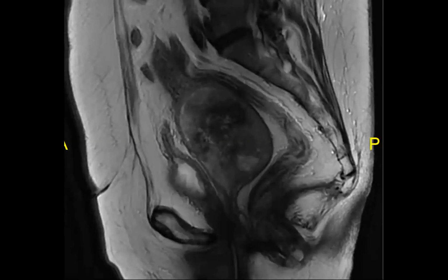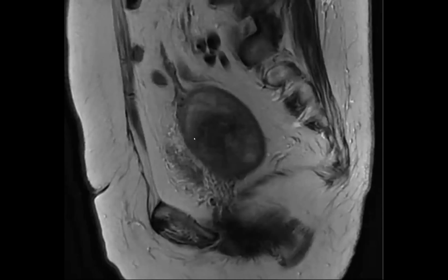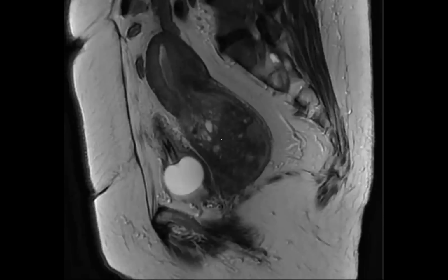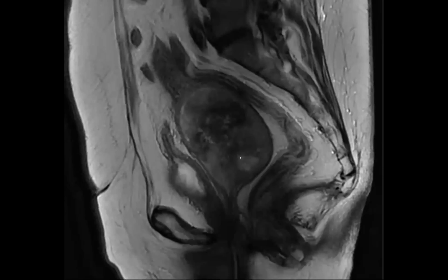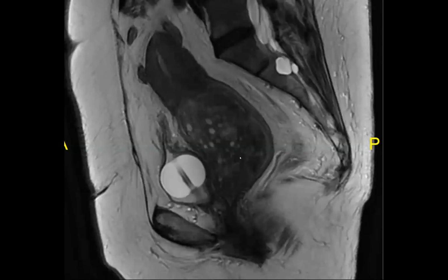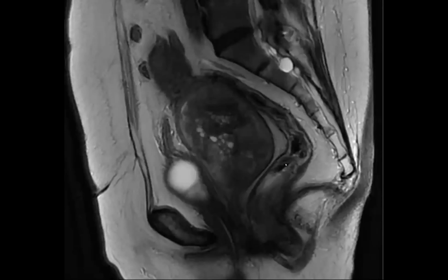So the path came back, and this is an interesting path. The path came back as adenosarcoma, right? So then I'm like, oh crap, I really didn't think this through. But when I read the path detail, it's actually pretty cool. This whole thing is a huge endometrial polyp, and there are a few microscopic areas of sarcomatous changes. So it wasn't completely far off. This is just micro. So you're not going to see that by imaging? Is that what you're saying?